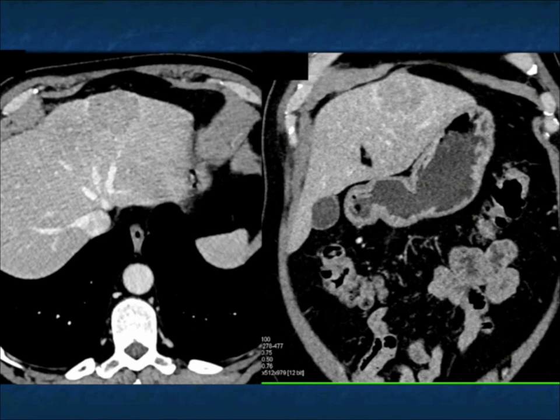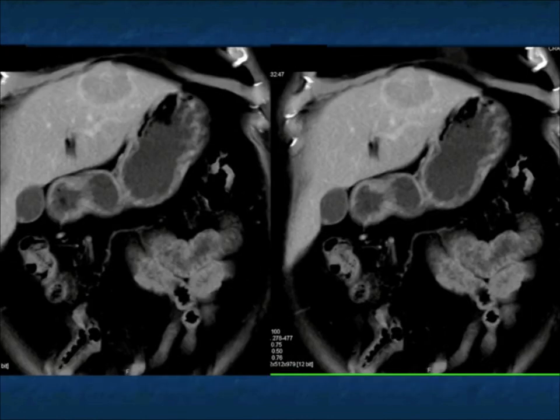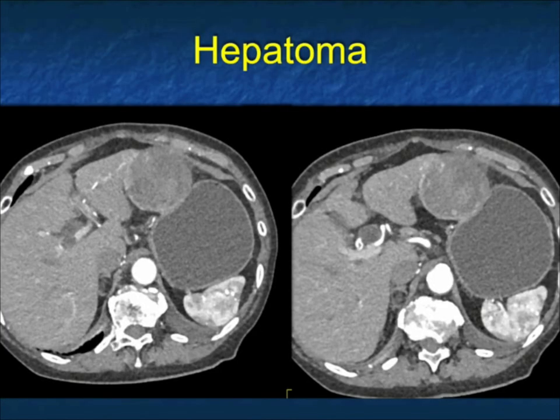So you will have two chances to make the diagnosis, but I think if you see the lesion like this, it's hard to say it's a hepatoma. It's the vascularity that really makes it possible. So very important to have the right phases, and that becomes critical. When people miss hepatomas, particularly on outside scans, it's usually due to poor protocol. If the protocol is done correctly, it's not hard to see these masses.